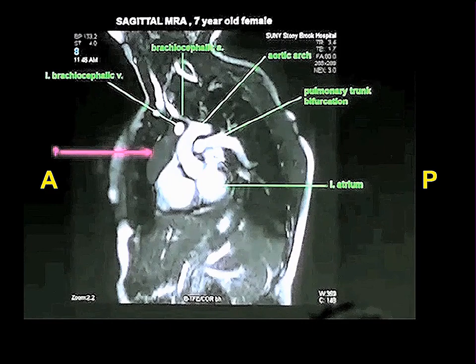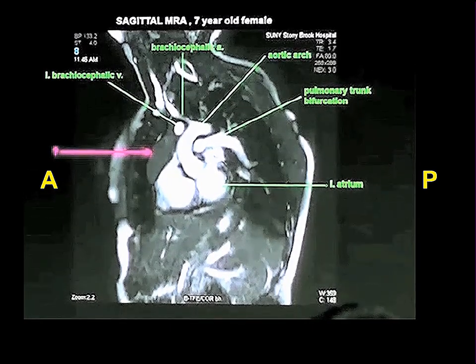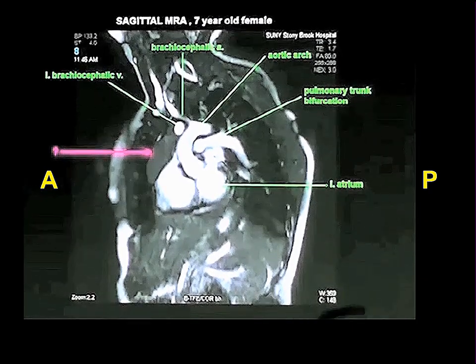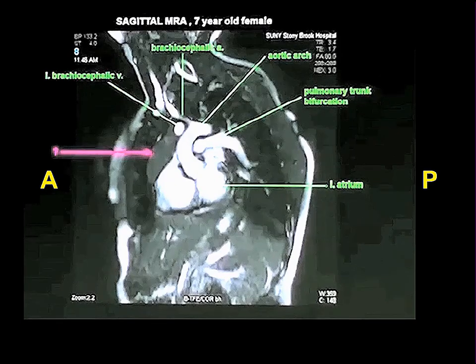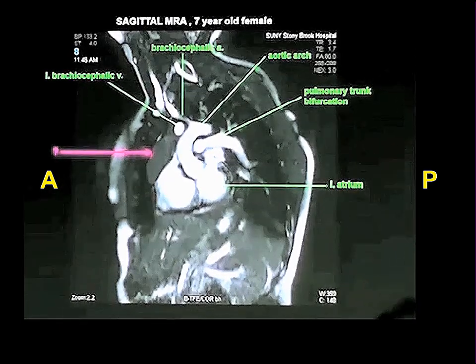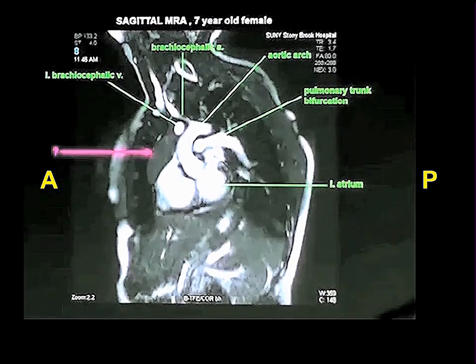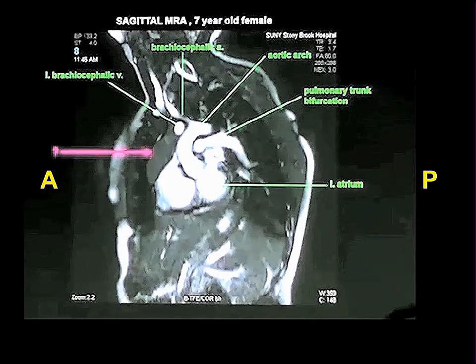What do you figure it is in a 7-year-old female? A horrible disease? It's your thymus. Thymus is a structure that in your cadavers will look like nothing. Globs of fat, if anything. But when you're a youngster, the thymus is an important immunologic organ. It is big and sits in the superior mediastinum, and descends into the anterior mediastinum as it does here.